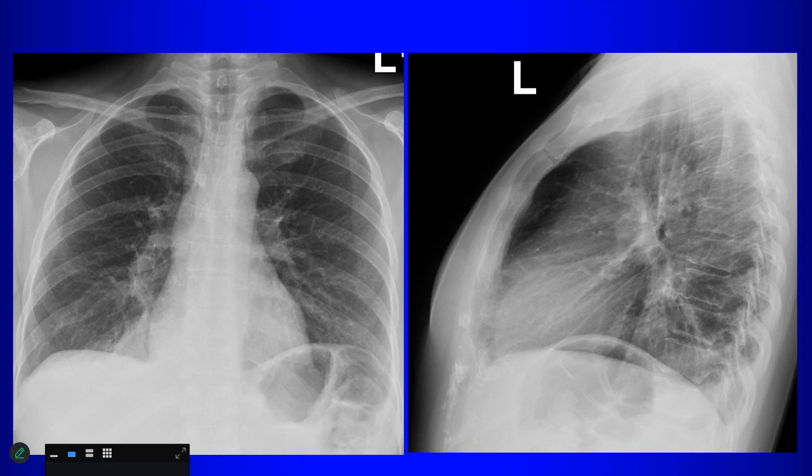Also, it is very important to look for both posterior diaphragms on the lateral view. Do you see both diaphragms on the lateral view? Especially posteriorly. Which one's missing? Right, the right. So what are you going to do now? Look at the frontal to see. Look at the frontal, and do you notice anything?